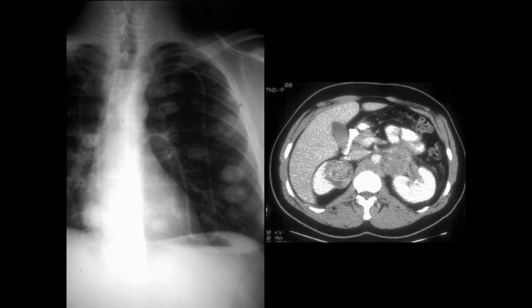So anytime you have a young kid with lots of horrible stuff, say, have you done a physical exam? Should we do a scrotal ultrasound? And remember that path isn't perfect. This was read as a renal cell carcinoma, and when we went back to the pathologist, they said, hey, you told us it was a renal mass. Instead, this is the adenopathy just pushing into the renal hilum, and they said under the microscope, the two of them looked the same. So again, it's clinical context bringing everything together.